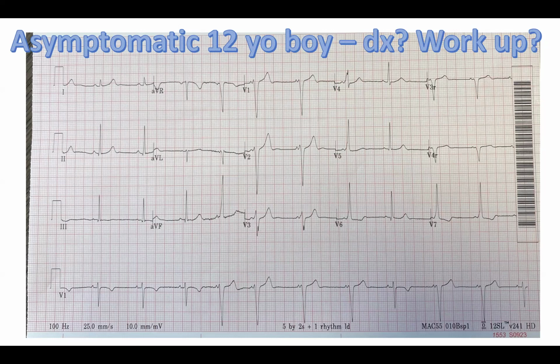If we were to follow the 2012 recommendations, this ECG alone would be, in an asymptomatic patient, considered adequate rationale to not do any further testing. And yet we have documentation that there's 1-to-1 conduction via the accessory pathway to 187 beats per minute, which would not be predicted on this tracing, where at this slowish rate in the 60s to 70s, we're not pre-excited.